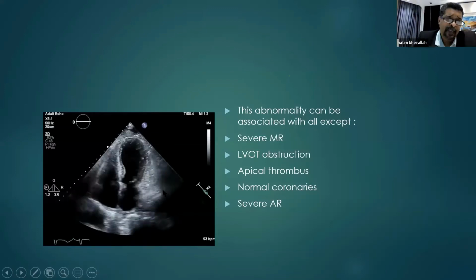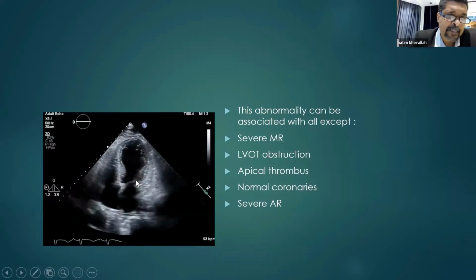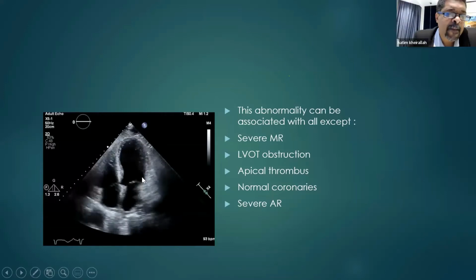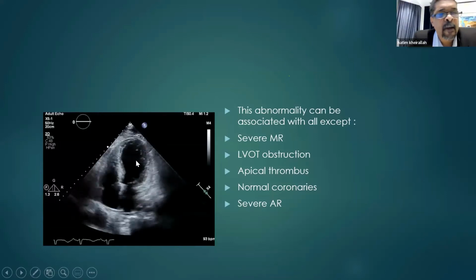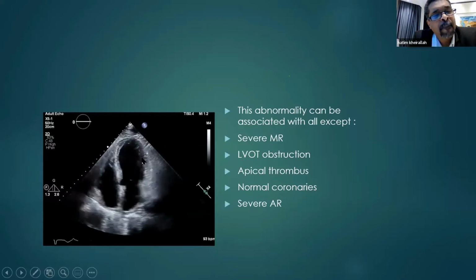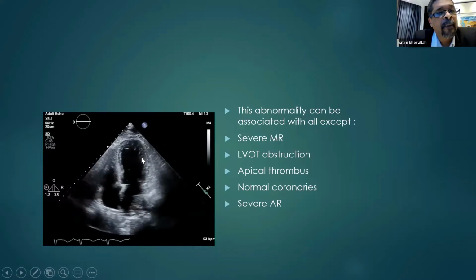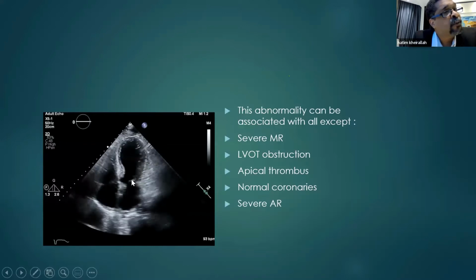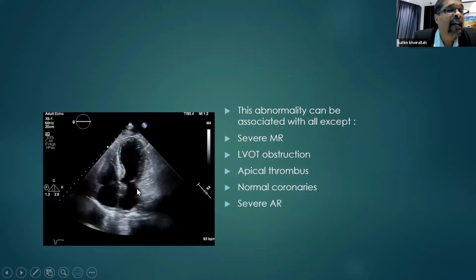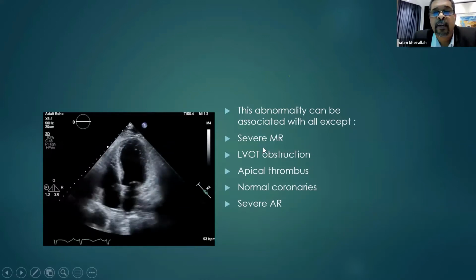But if it affects the annulus, I would be expecting that the base would be affected. Okay, but here the base is hyperdynamic. But still, if you look here at the cursor, the mid cavity is where the papillary muscle anchors. So it might be pushed apart and that leads to functional MR. So it can be functional MR due to displacement of papillary muscle, or it could be MR due to some other mechanism. I'm gonna tell you shortly.